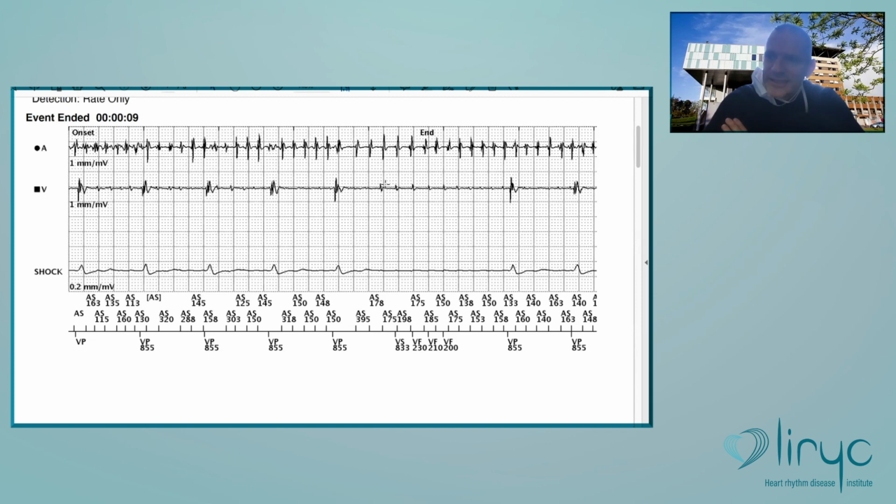In Boston devices, you are probably much more sensitive after right ventricular pacing than after right ventricular sensing. Therefore, in dependent patients like here, there is an increased risk of oversensing of small signals, and of course prolonged oversensing of small signals, and therefore of symptoms. And sometimes in this patient, you will see prolonged oversensing, and at the end, a shock is delivered.